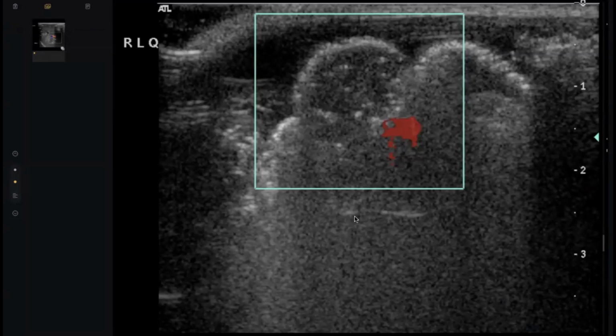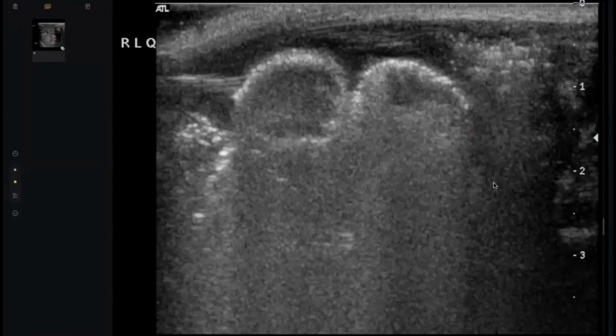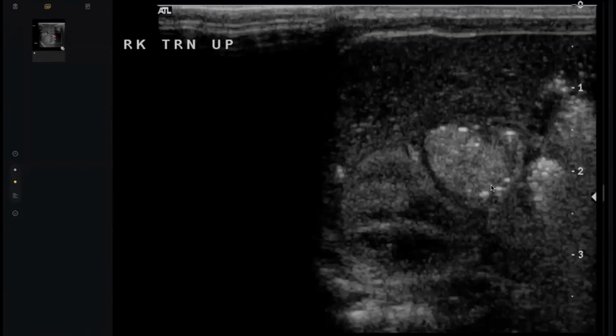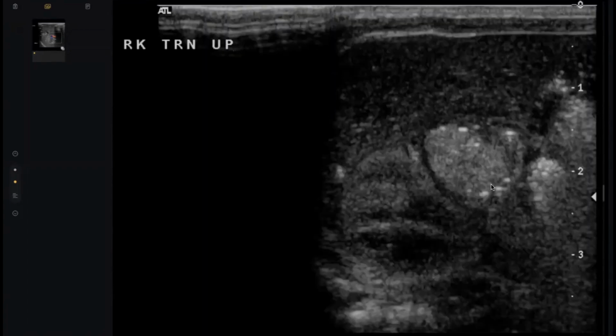So I have presented with a single image ultrasound study. Are you sure this is single? Yes, there are multiple images, with B-mode and color Doppler, scrolling.